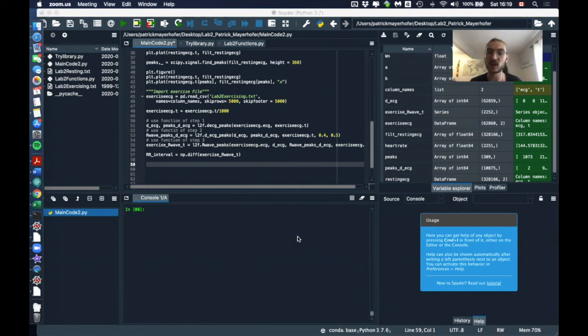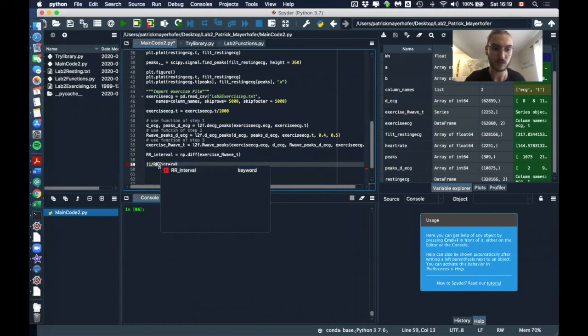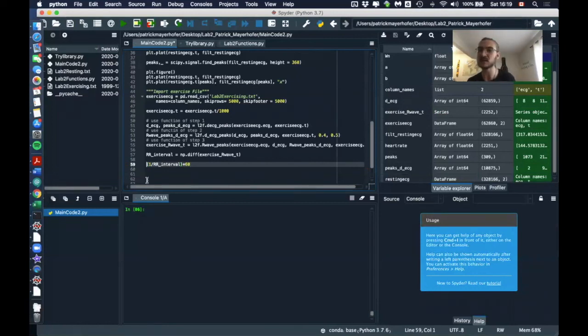So if you want to calculate the heart rate now, we basically just need to say 1 divided by the RR interval. So that's the frequency then, but since the frequency is in seconds, we also need to calculate it times 60. And if we calculate times 60, then we are in minutes, which means now we are in beats per minute.